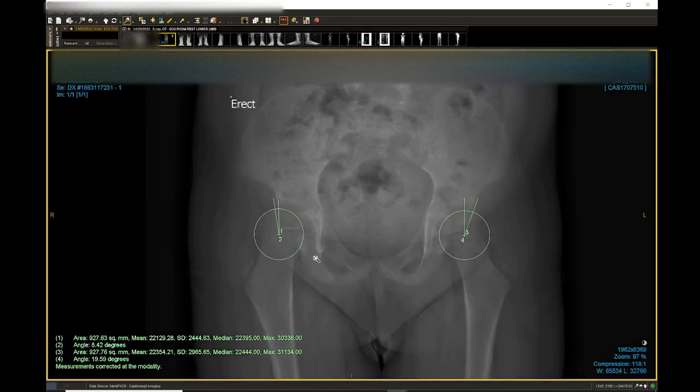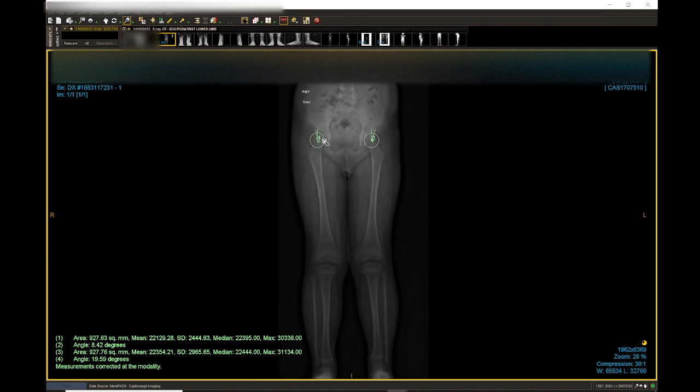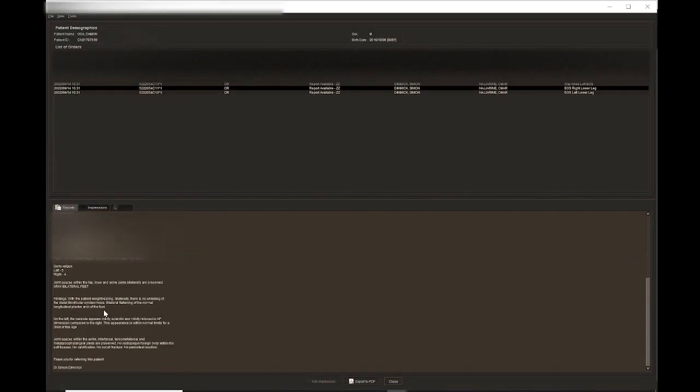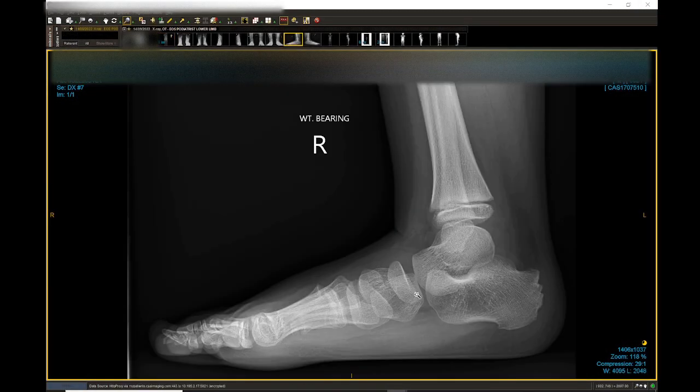So here's a patient, a child, and they were walking on their tiptoes. All right, and you can see they've actually flagged it here. Okay, they've actually flagged it, and they've measured, and they've realized that there's hip dysplasia, and this one was actually referred to a pediatric orthopedic surgeon for surgery. And if you click on the actual report, so we go to reports, I don't know if you can see, but it would mention here that there is hip dysplasia. Okay, and further tests need to be carried out. So yeah, that's generally what a leg length scan involves. With this one, we did order some full x-rays too. They came in the same file, but that's separate.